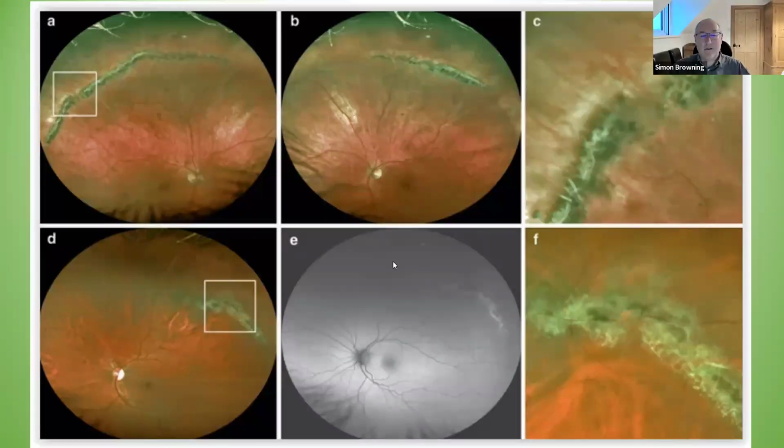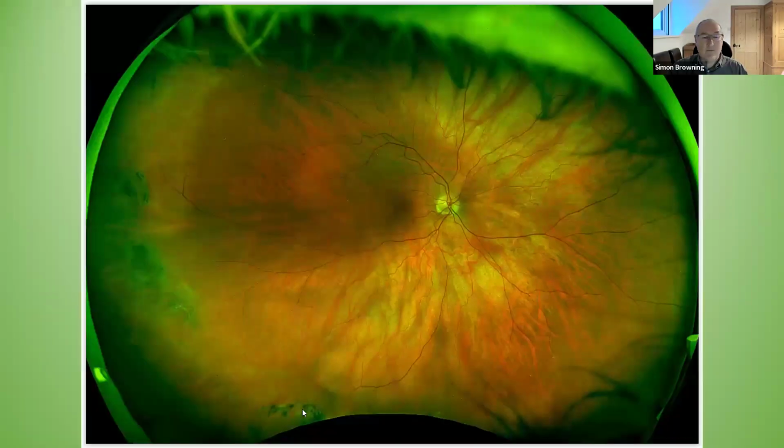And these are some of the images. I could show you thousands of these and they'll all look different, but you can see the characteristic view: lots of pigment, here are your white lines, white areas, pigmented areas, and little breaks. These are some taken with Optomap. You've got the pigmentary degenerations and the little white lines.